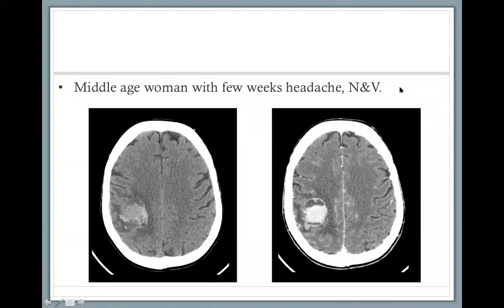The white spots are blood vessels on the second image. They are small, tiny blood vessels along the meninges, including the falx. So this image is with contrast and this is without. Now, this is the main abnormality. This is a brain mass or a brain tumor.